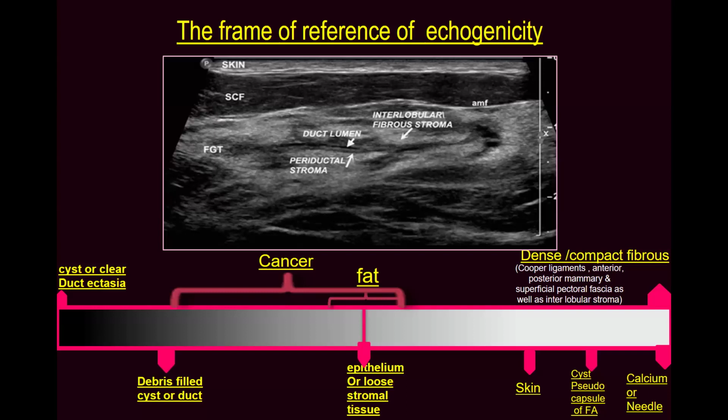Because fat is available in all breasts, that is why it is chosen to be the frame of reference, okay?